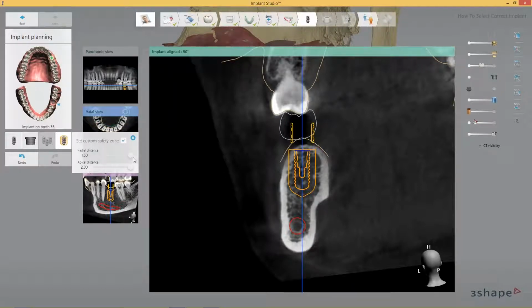So these are the standard measurements that we have in all software. All right, so there's a way out for every need. In general, the safety zone will prevent you from proceeding in the software and making violations, but if you actively take a decision, then you can move on.